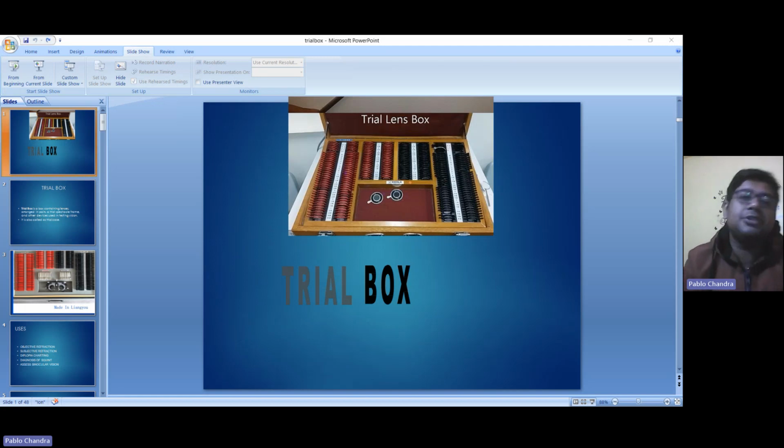Now, why is this full aperture required? This full aperture is required because whenever you have any visual field problem, you need a full aperture lens to increase the visual field. So in those cases, you can use full aperture. Patients where you need the full vision, especially low vision patients, glaucoma patients, all these patients need full aperture lenses. Here are the full aperture lenses, concave and convex, both can be seen. Even accessory lenses can also be made full aperture.